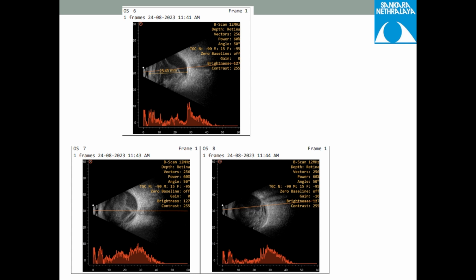RD comes from the dead center of the ONH, whereas PVD can be attached to the edges, or if there's a tissue on the center of the ONH, like a fibrovascular proliferation, it will be attached to it. And RD will never cross over each other. Meaning two flaps of RD will never go across each other, not like an X pattern. Vitreous can do that, because vitreous can undergo schisis.